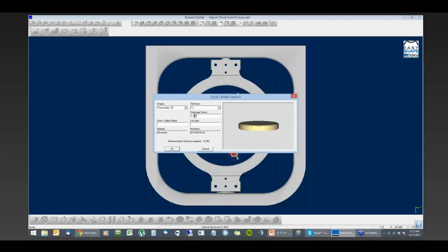So our shrinkage factor, because this is zirconia, I'm going to put in like a bogus factor of 1.224. You would get this off of the disk directly. You would specify what the thickness of the disk is. And just like when you're creating your disk normally, it's going to also tell you down here, based on the STL items that you've imported, what the minimum thickness of a disk that you're going to need. So you'll know even before you create this disk to bring it in.